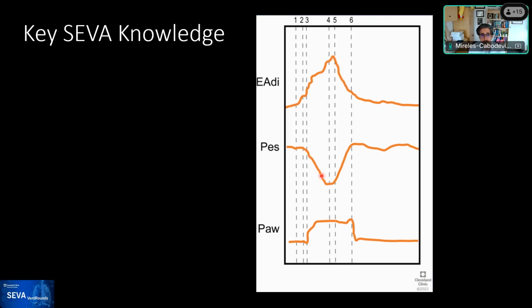The point where it reaches the maximum drop in pressure is pointed by 4. So you can see that there's some uncoupling of the two signals, which can happen. But usually it would be 4 after 5 here. That's what you would expect to see. That's the end of the breath, and then the muscles start relaxing. Finally, number 6 here is the end of the actual mechanical breath.